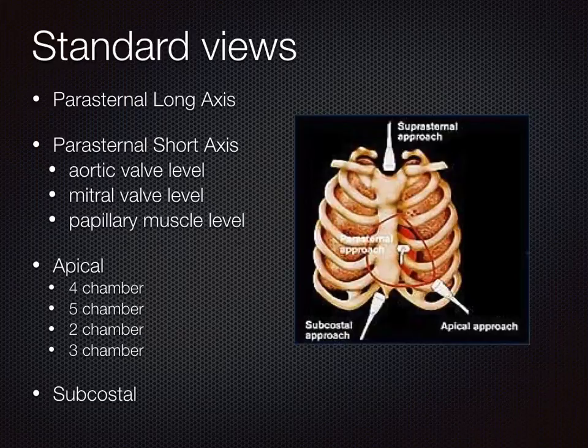Okay, so that's the physics over. You're probably going to be quite relieved now. Okay, so let's have a look at the views of the heart. Here's a typical view range that we will see. And as you can see, there's parasternal views, apical views, and subcostal views.